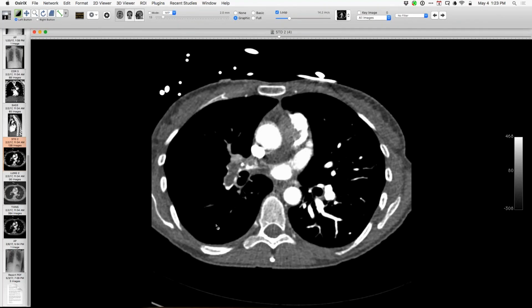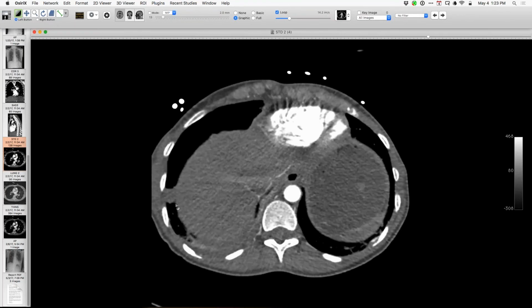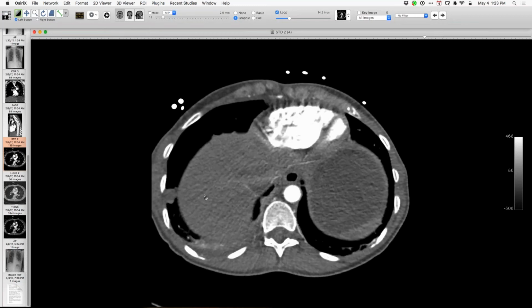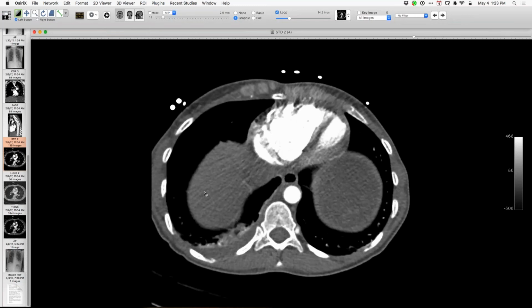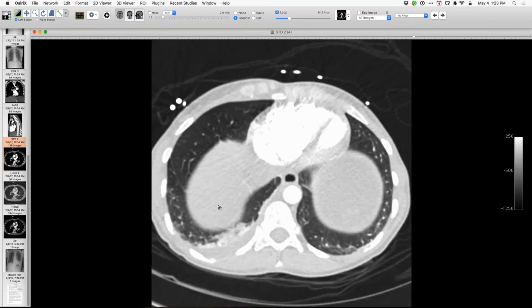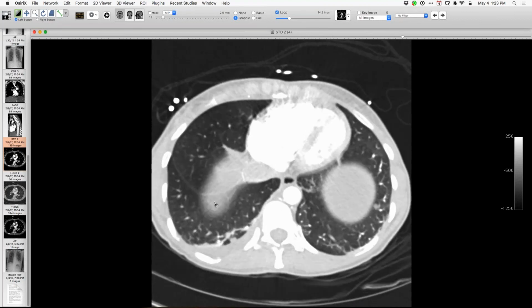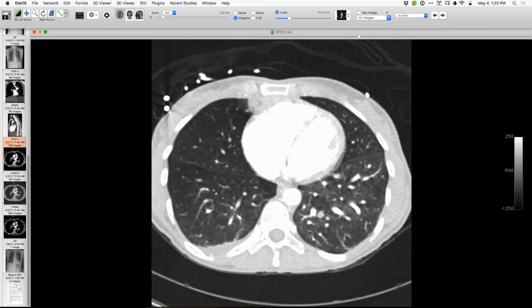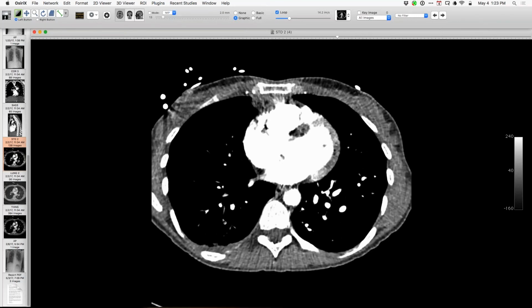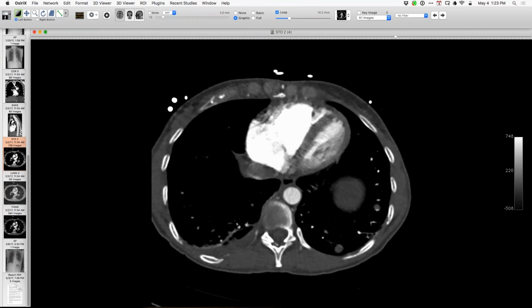So a needle biopsy was done of this lesion down here. I know that wasn't an appropriate one to go for because that has features of an infarct, whereas these round things do not look like infarcts. So findings very typical, all in all, of a pulmonary artery sarcoma.